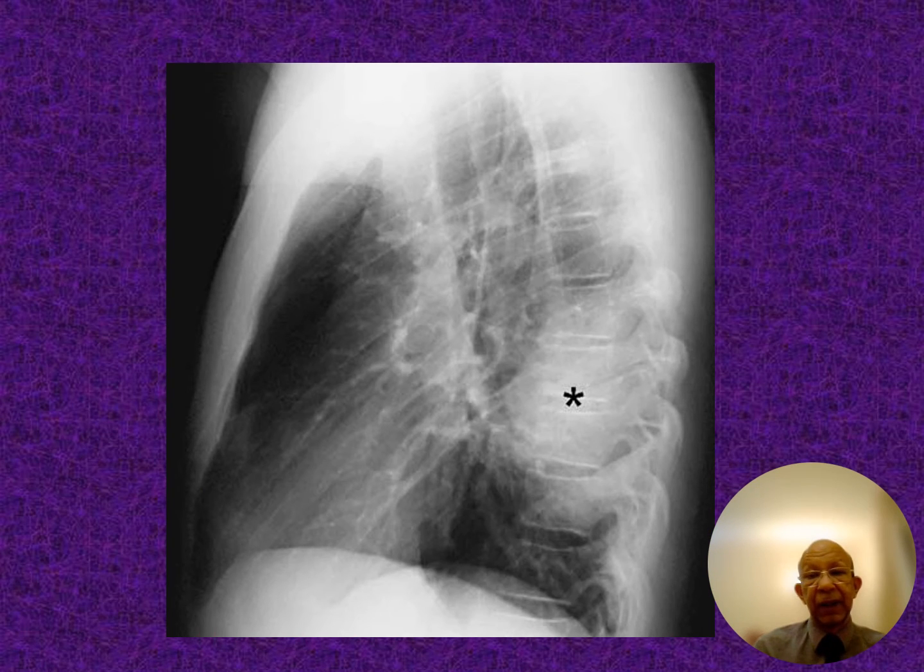Okay. Now the broken rule here is that you should be seeing something which is darker as you go down. If it's getting whiter as you go down, then there is an area more white than it should be, and so it is suggestive of a mass or consolidation in this area, possibly in the left lobe. Okay.